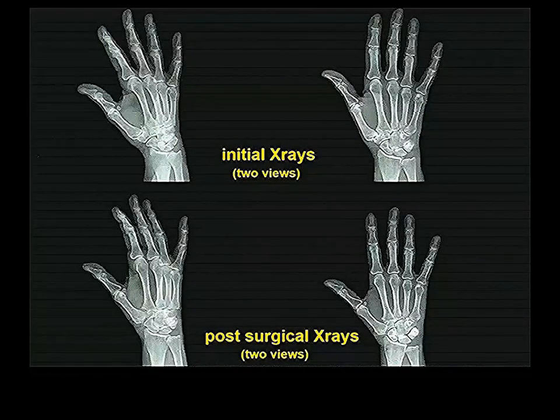Here's not a young person. Let's look at the bones here. Triquetrum and pisiform are there. Lunate, scaphoid with its tubercle. Hamate, capitate, trapezoid, trapezium. In a slightly different angle, you can see the trapezoid and the trapezium more clearly separate from one another. As you rotate the wrist, these bones become either less or more discernible.